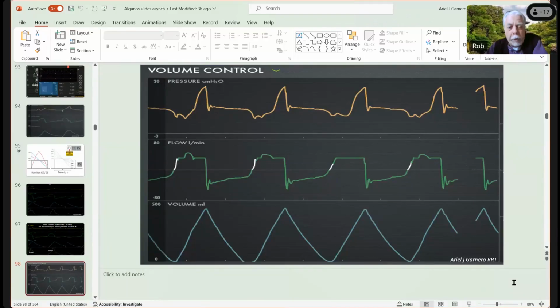Sometimes we see a constant inspiratory flow, as we see in breath number 3, constant flow. But we see in breath 1 and 2 and 4, we get a little hump right in the middle of the inspiratory time. What does that indicate to us regarding the targeting scheme?